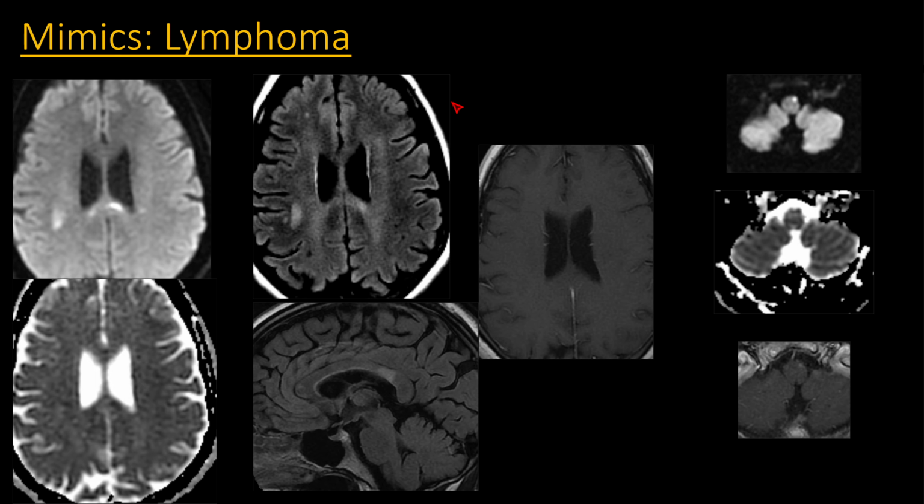You can see at initial presentation, you had a bunch of hyperintensities, sort of oval shaped. Diffusion restriction was a very prominent aspect of these lesions. You can see here over the corpus callosum with restricted diffusion, here in the deep white matter maybe a little bit of diffusion restriction there. You can see here again that corpus callosum lesion, another hyperintensity here. Not a lot of enhancement associated with those. There was another lesion in the medulla that was diffusion restricting and perhaps a little bit of enhancement.